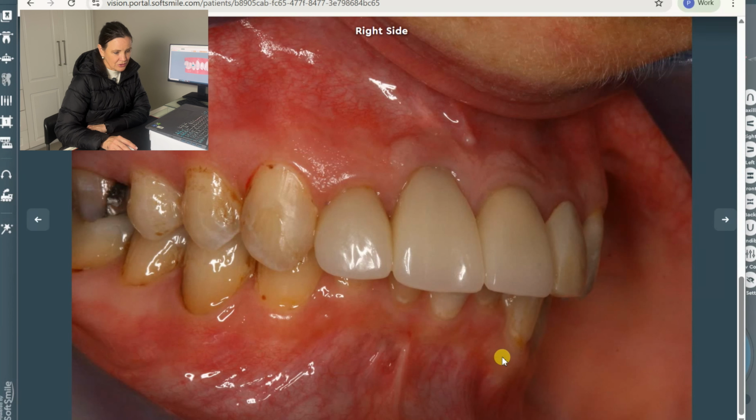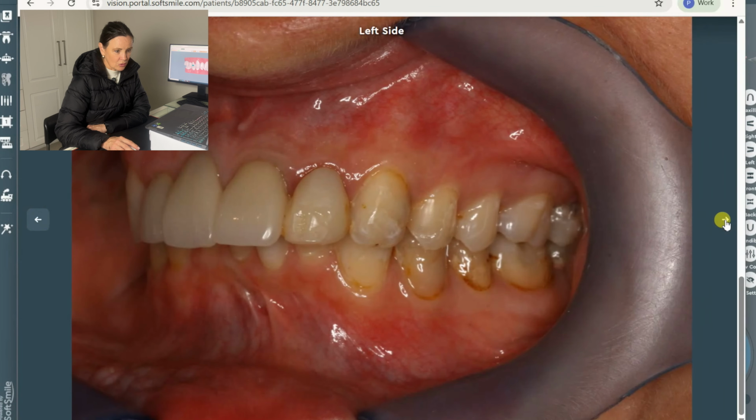That tooth already is on the edge, almost through out of the attached gingiva, very little attached gingiva here. On the sides, if we go out buccally, we have to go out buccally at the top as well, creating space, and the dentist doesn't want movement at the top. So it is a challenge. How are we going to address this?